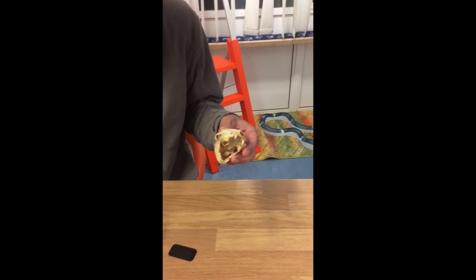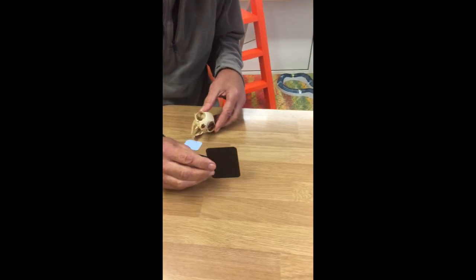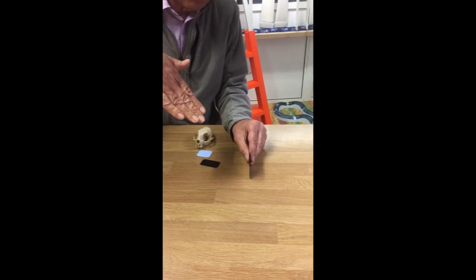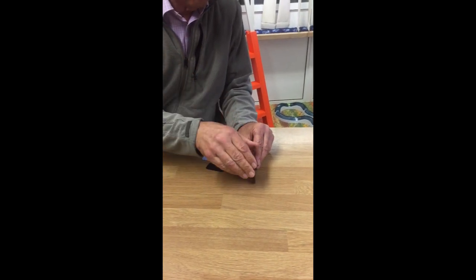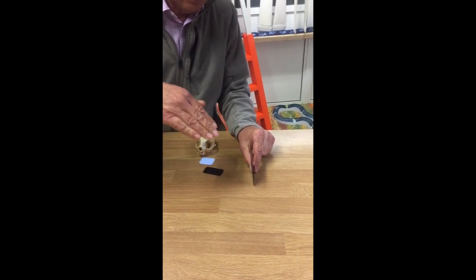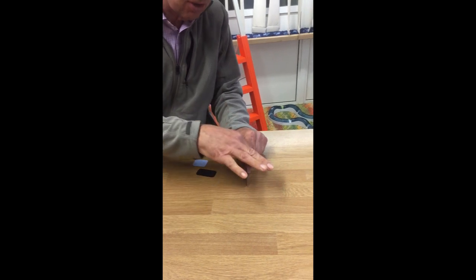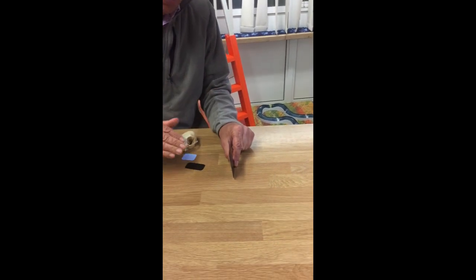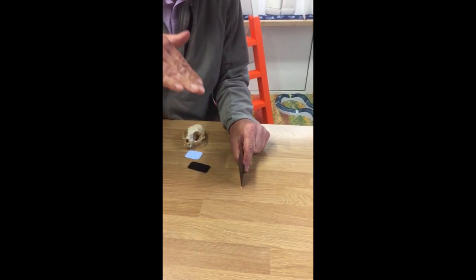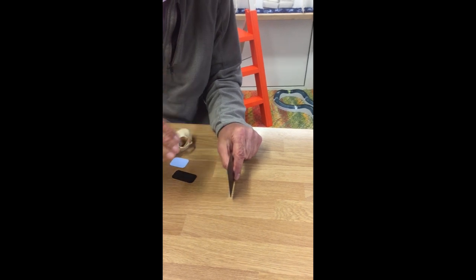But we can't do that with all our teeth. So we then need to introduce the concept of the tree and the sunshine. If we have a tree with the sun shining on it, when the sun's beam is coming in at 45 degrees, the length of the shadow will be the same height as the tree. As the sun drops down, the shadow lengthens. As the sun rises, the shadow shortens. So we can distort our image unintentionally by having the wrong angle of the beam, and that's why we need to get all these angles correct.